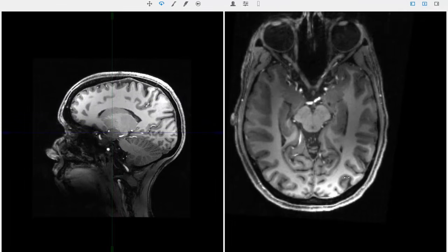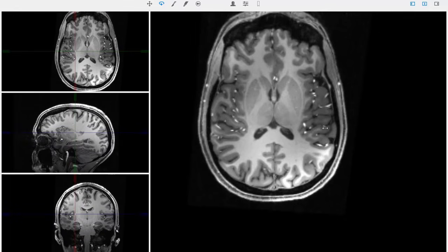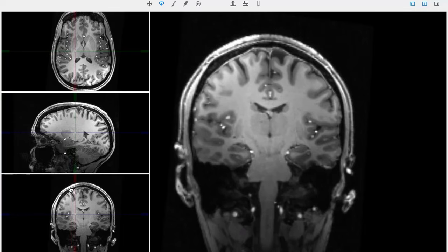Now we're seeing occipital lobe down here. You can see temporal lobe quite well here and here. And this hidden lobe inside, if you put your fingers inside the sylvian fissure and punch, you'll get another cortex deep inside the brain. That's called the insula, an area important for empathy and putting yourself in another person's shoes, and taste cortex is there too. Here we're going to look in the coronal view at all the different lobes.